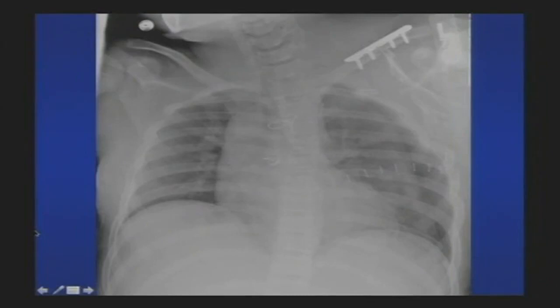So let's start with pneumothorax. This is something that is pretty basic, but very important. There are certain things that you should never miss on a chest x-ray: line and tube malplacement, but pneumothorax is certainly one of those. So we'll briefly go over pneumothorax.